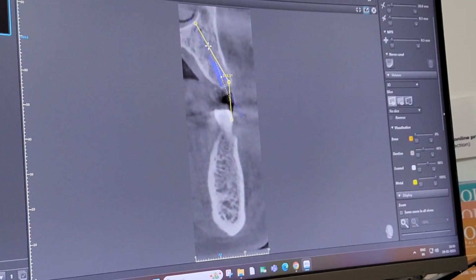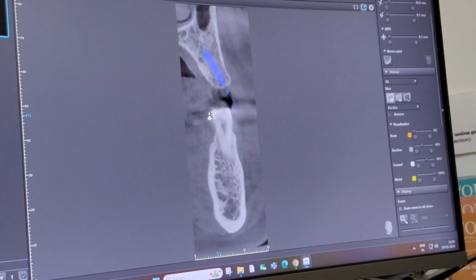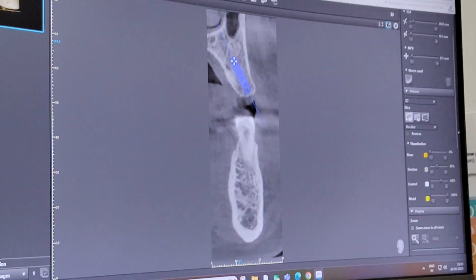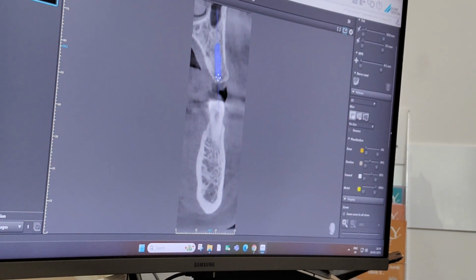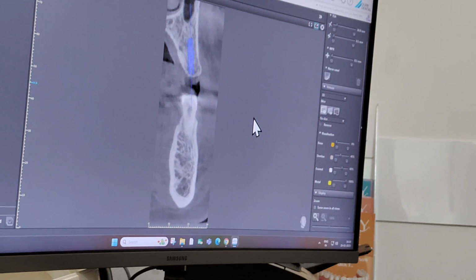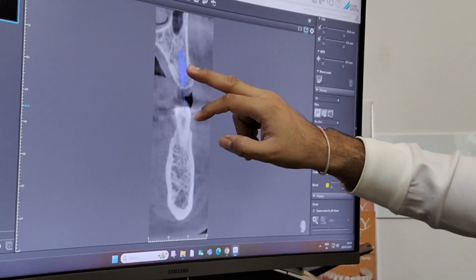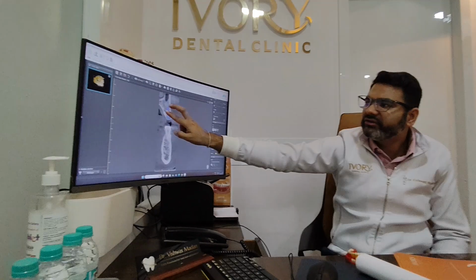So what we can do, we can इसको हटा देते हैं. So what we can do, we can make this little straighter, this more palatal. Okay. ठीक Straight है. So now we can do it with the straight abutment. इधर है, but नहीं रहता, तो क्या करते हैं? Because we want to have a really good width. हाँ, but if width was not there.